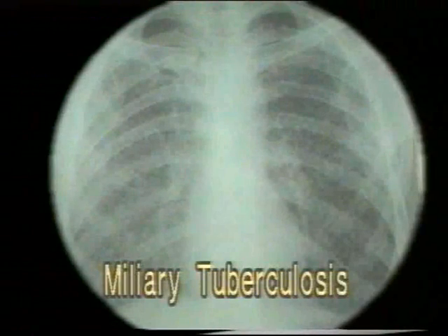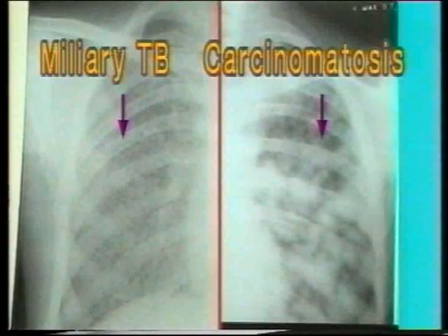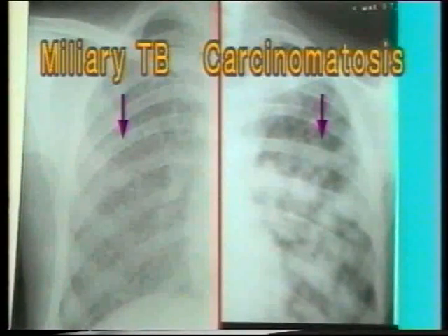Compare it with the opacities in miliary tuberculosis, which are 2 to 3 millimeters in size, uniform and discrete. Once again, let us compare them side by side. On the right, the opacities in secondary carcinomatosis, which are larger, varying in size and confluent, while on the left, the opacities in miliary tuberculosis, which are smaller, uniform in size and distribution, and discrete.